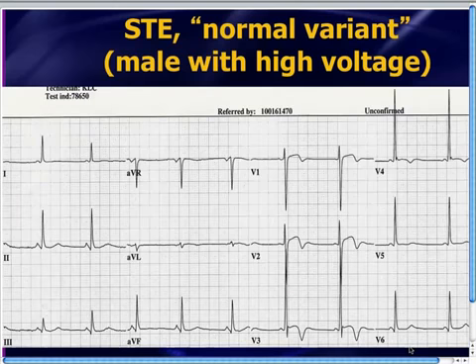Here's another example. Some pretty scary looking EKG leads up here, but in this particular case, take a look at lead V3, right? When you look at V3, you see that fishhook type of pattern, and then it's concave upwards before the steep drop. There's a fishhook in lead V4 also.